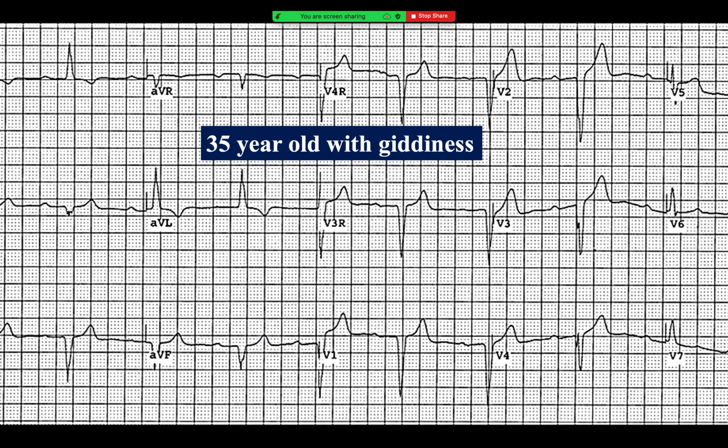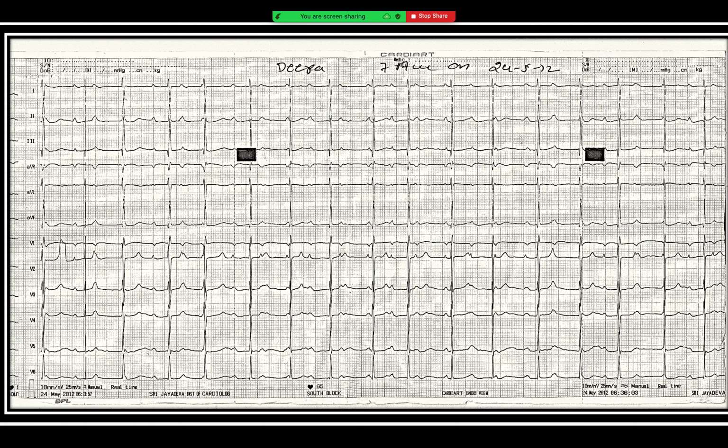PR interval definitely seems slightly on the higher side, yeah. And in V1 to V6, there are Q waves as well, but it's not there in V5, V6. Yes? And the T waves are very prominent. So what is the diagnosis which I had said earlier itself? CCTGA.